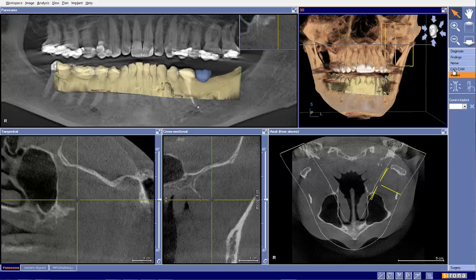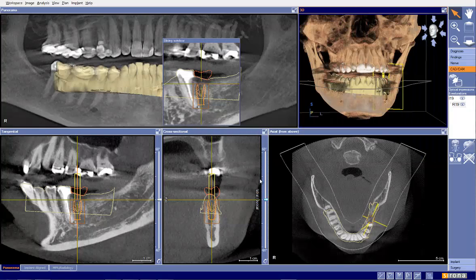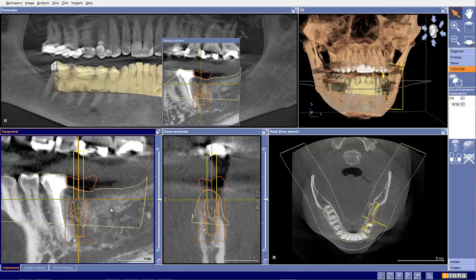So as I showed in one of my quick tips earlier, we're going to use the CAD/CAM tab to place the implant. So we'll go to the CAD/CAM tab, highlight the restoration, tooth number 19, see how it's highlighted here. Go to the button that has the crown with the implant on it. Click insert implant. Notice that it'll bring in that this was designed as tooth number 19 in the CEREC. And then we'll go ahead and plan for our ideal size implant, which here is going to be the 5 by 11.5 implant. And again, these implants are totally rotatable and manipulated, so that you can share with your patient exactly what a dental implant is. And now this will drop the implant down the long axis of your designed restoration.